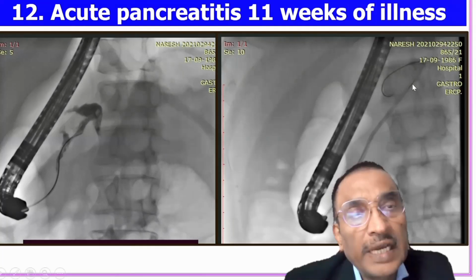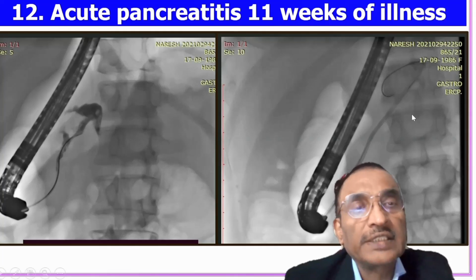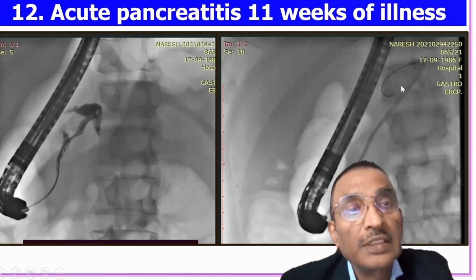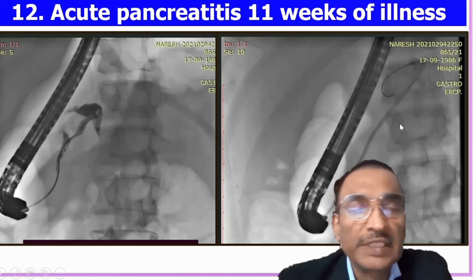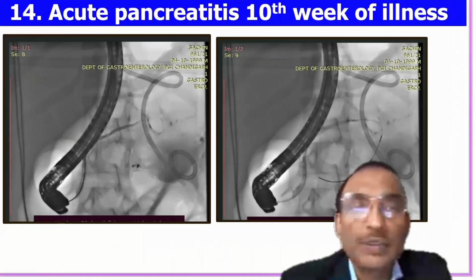So when you are dilating a stricture, this radiopaque marker should be beyond the stricture segment, so that you are not using the floppy segment for dilatation purposes. So this should always be kept in mind if one is placing a second or third stent or doing a stricture dilatation. That should be beyond that.